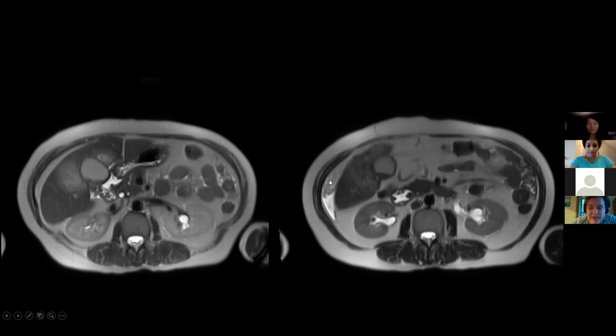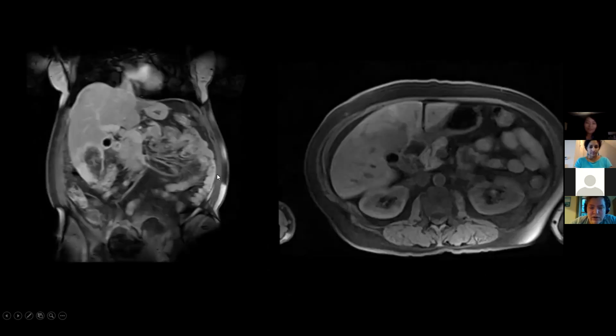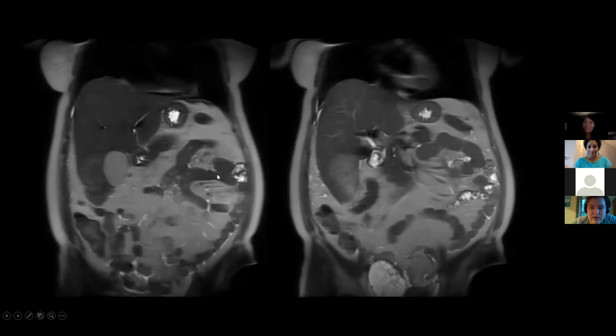So here are a few more images. Again, we see this kind of peritoneal stuff here. Coronal images, which certainly, it's very heterogeneous. I take it back. It doesn't look like it's gallbladder in origin now. So yeah, you see the gallbladder itself?